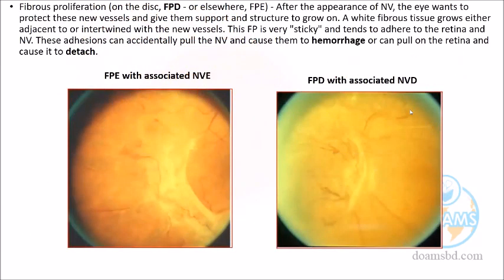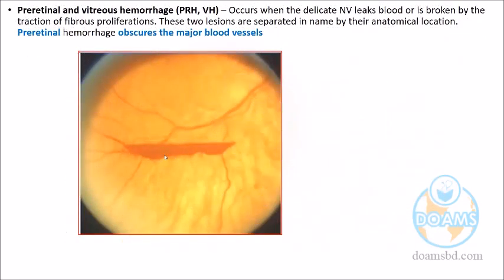So it is a point of no return really, right? And wherever there is fibroproliferation, there is a chance of bleeding. So it can cause retinal bleeding, pre-retinal bleeding or retinal bleeding. It can detach any time. So this is the bleeding, and is it retinal hemorrhage? We have seen dot hemorrhage, blot hemorrhage. What else? That one, flame hemorrhage.